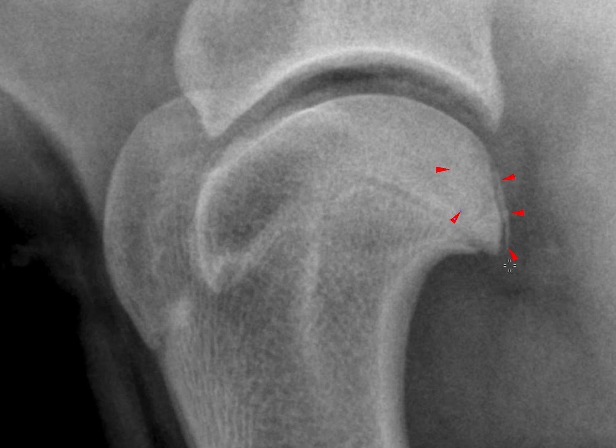Now, as the cartilage fails to form into bone, it will eventually get thicker and it will break off into fragments or flaps, which generally are made out of cartilage. And as they are made out of cartilage, they are soft tissue opacity, and generally we do not see this on radiographs. However, here we can see this flap perfectly. And the reason is that this cartilage here has undergone some degree of dystrophic calcification.